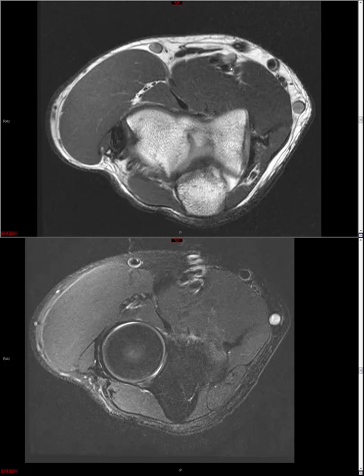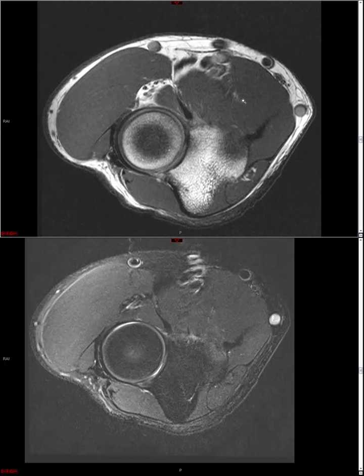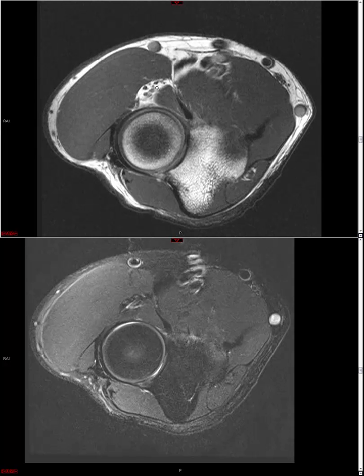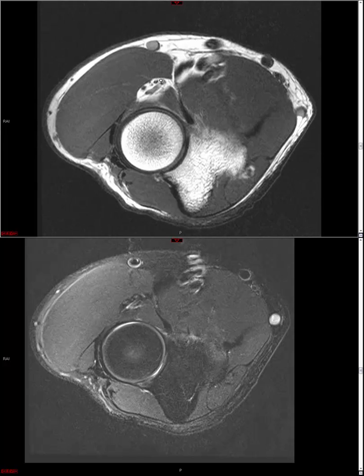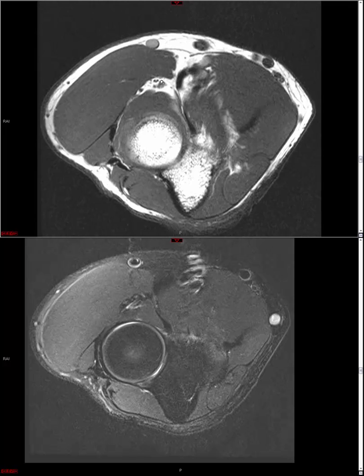All right, so that's the ulnar nerve. We touched briefly upon the median nerve. Let's look on the contralateral side now. So this is the brachioradialis muscle here on the lateral side. So once again, pronator teres on the ulnar side, brachioradialis on the lateral side, and the brachioradialis is a great landmark for the radial nerve. So I find brachioradialis, and usually deep to the muscle you're going to see perineural fat, and within that perineural fat is going to be the radial nerve.